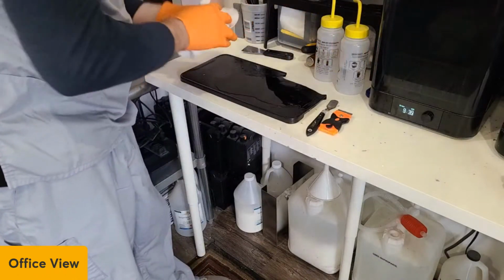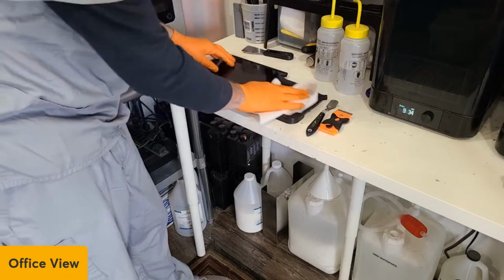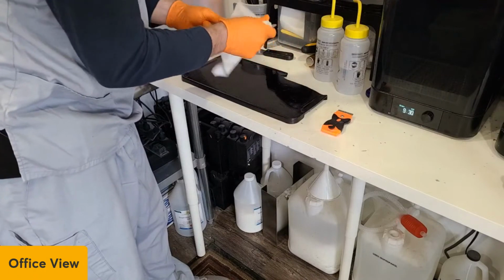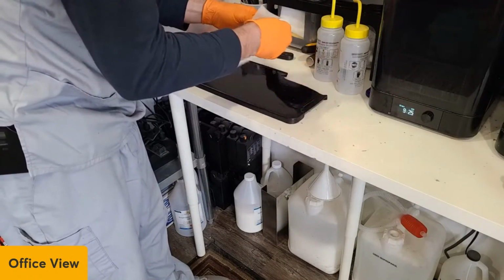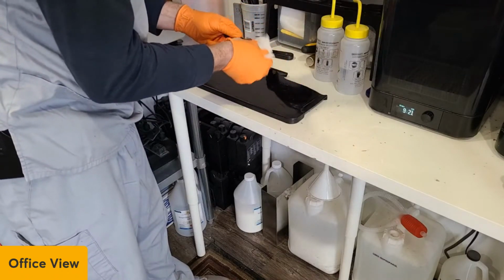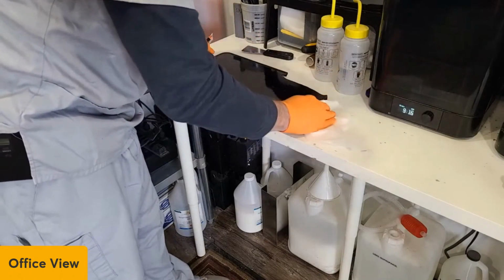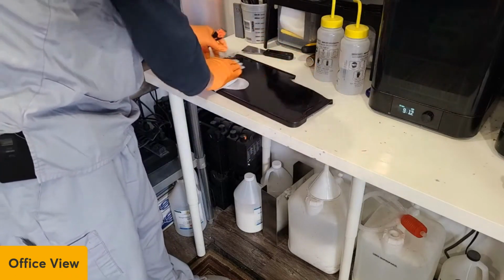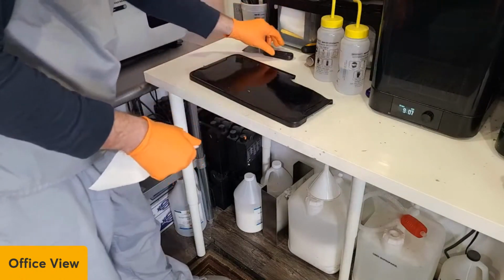That is annoying. This little build plastic thing comes with the 3D printer when you buy it, especially the first one you buy, I think. Maybe. I mean, I bought the Form 2. That's why it's all broken and stuff. I've definitely abused it, but I like to be careful with all my prints and stuff, and I think this is a good pad for that. So then I clean up all my tools, put them back everywhere.